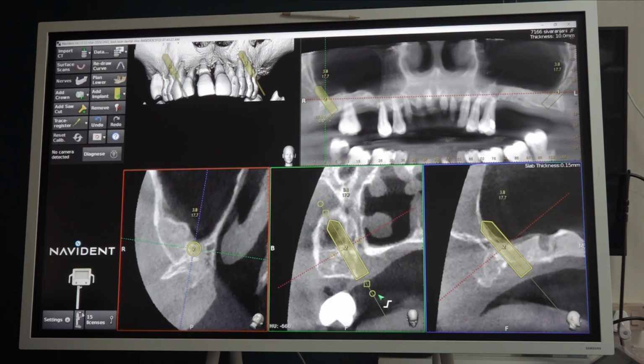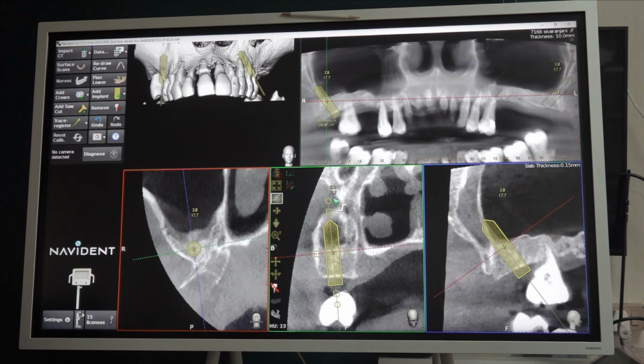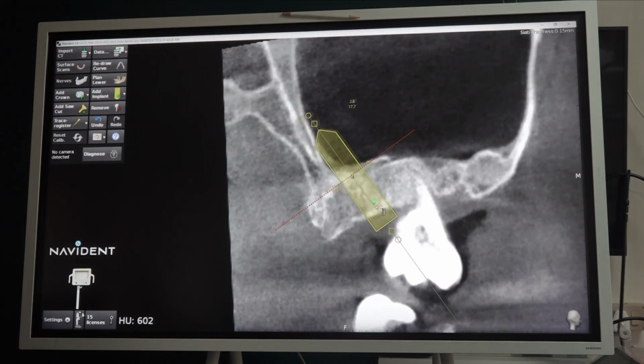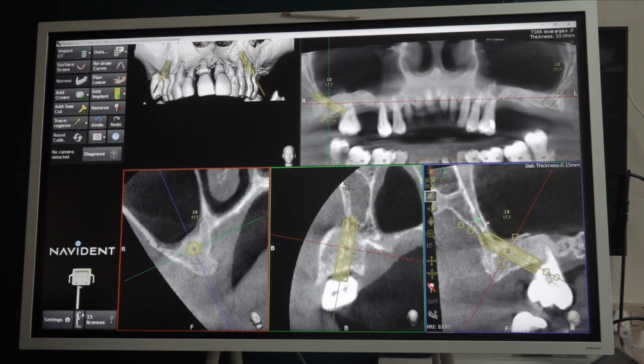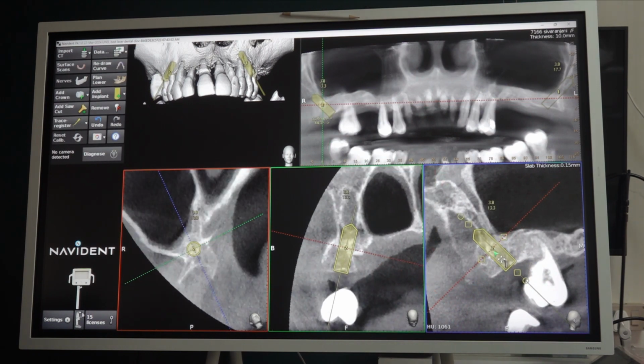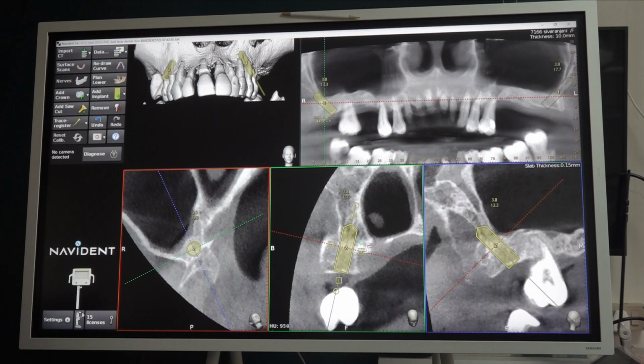So, right side. This is 8. 8 serves as a landmark. You start from this block 8, and you have to tilt like this. Then only can you avoid the sinus, right? We don't know if it is 8 or 7. It is 7, right? If it is 6, this is 7. So yes, we are going to start from 8. This looks right.